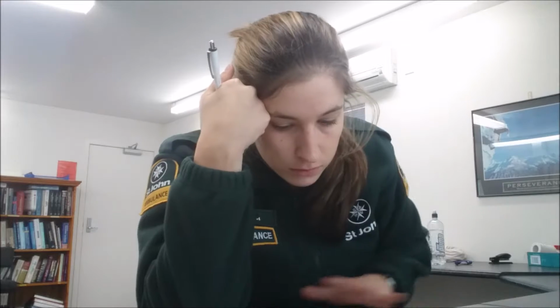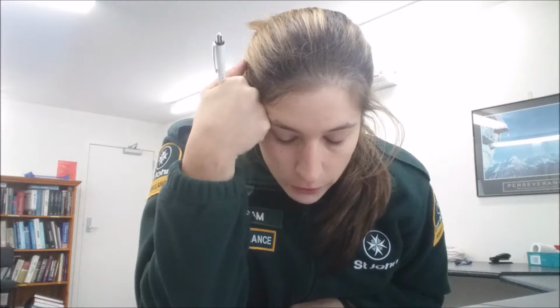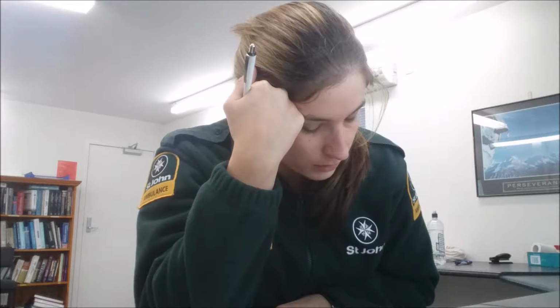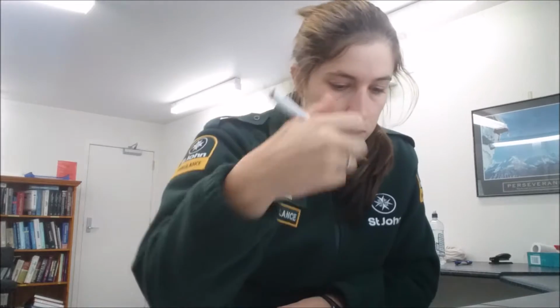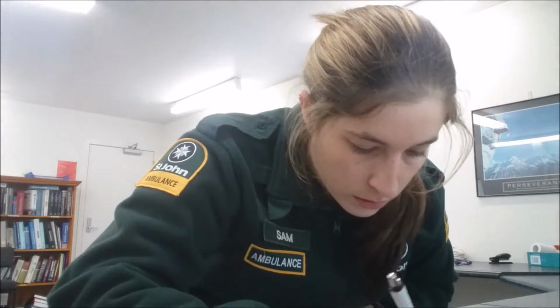Let's move on to the P waves. So we've got P waves in all the leads. They look quite peaked, especially in lead 2. And we've got QRS to every P wave. P waves also look a bit long, so we'll just work out.